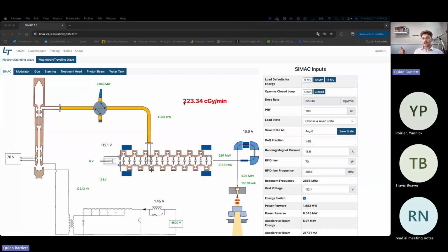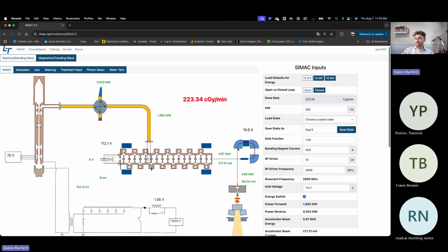So today I did want to focus on saving and comparing our beams, because it's a function of our simulator that is very useful to a lot of our customers, but we don't think it's very well known. On both of our simulators, you can save any beam that you create, give it a name, and then you can either rerun it in the simulator or run them on our water tank and compare them on the same screen. I'll take you through that and show you what that looks like.